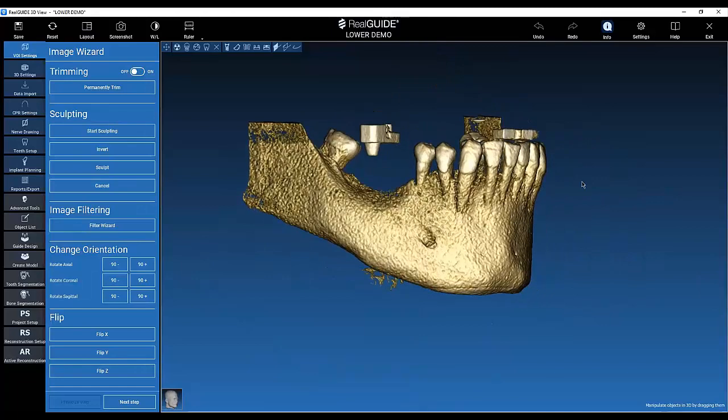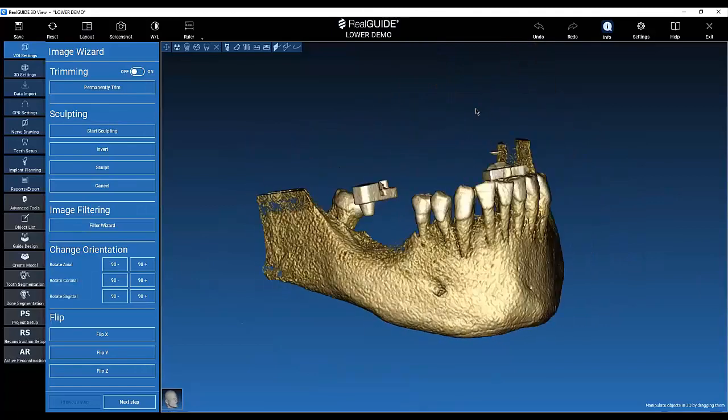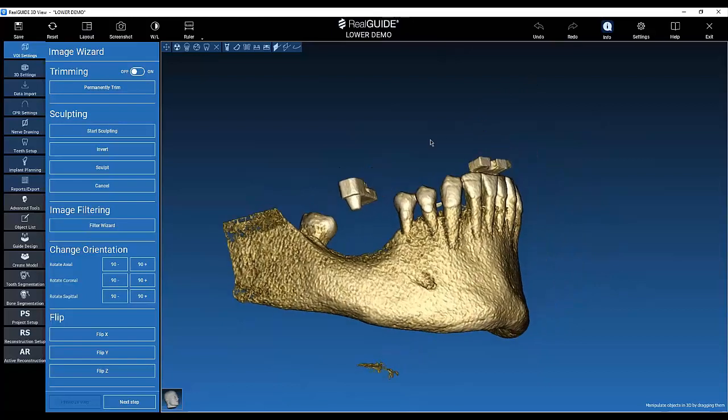Okay, so I can't see the parts of the DICOMs I have removed in this project. The DICOMs are not affected by this modification, so you can close down and open your DICOM again and see the complete exam.